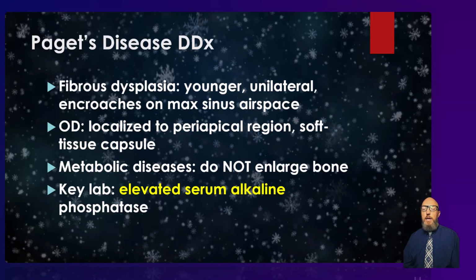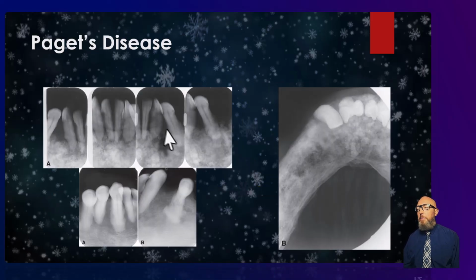I just want to reiterate, but if that's the only one that's high and it's super just off the charts high, think of Paget's. All right, so I've showed you these pictures already, but this is the picture to have in mind for Paget's disease, that nice tufts of cotton wool.